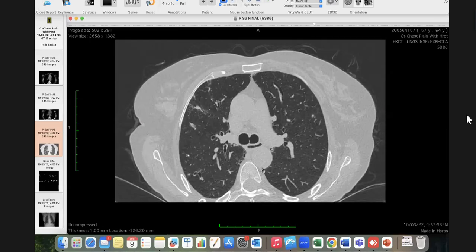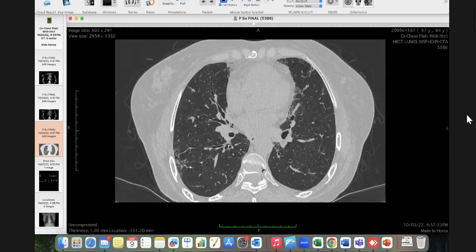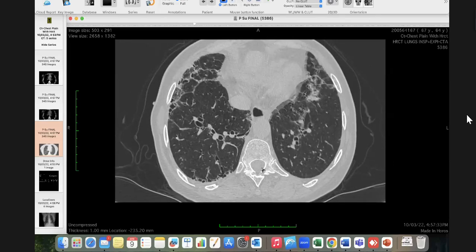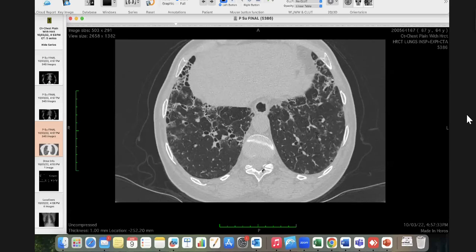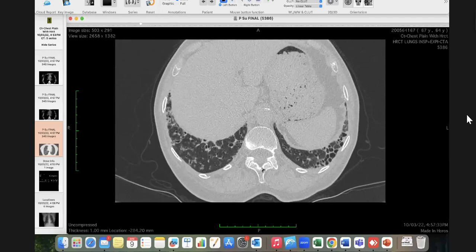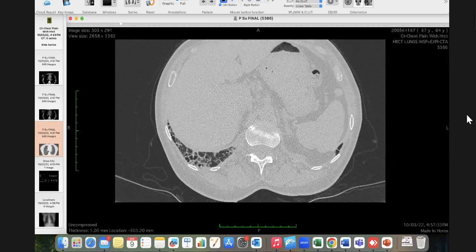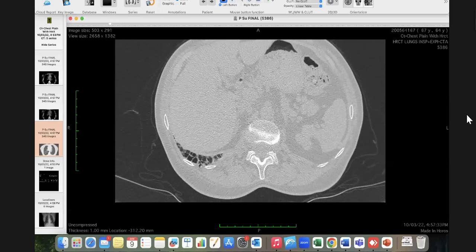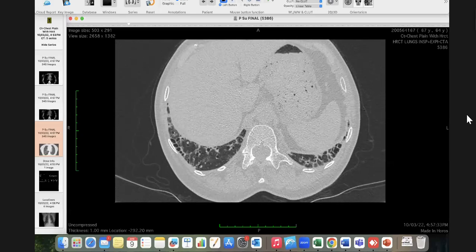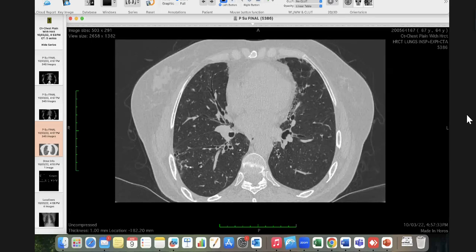I am dealing with interstitial lung disease, and as I go down, I start to see honeycombing, unquestionable honeycombing. And to my surprise, this is lots and lots of honeycombing. I did not expect, when I was scrolling through the upper lobes, that I would see so much honeycombing at the lung bases. The term we use for this kind of honeycombing is exuberant honeycombing. Again, this is a feature which is seen more often than not in connective tissue ILD.